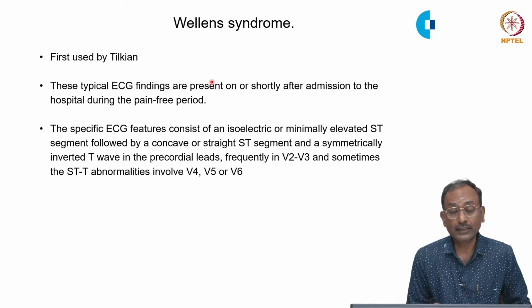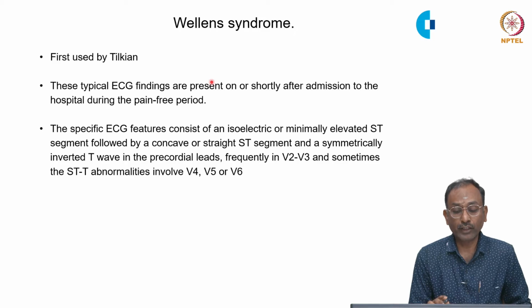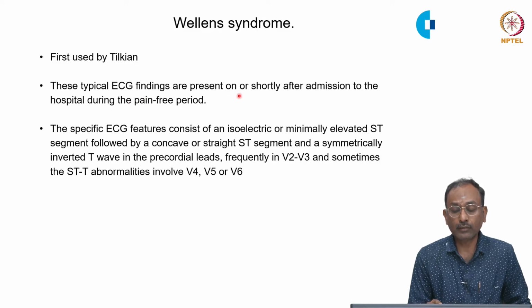Now, I am going to discuss a subtype of unstable angina called Wellens syndrome. Identification of Wellens syndrome is very important. The term Wellens syndrome was first used by Tilkian. The typical ECG findings are present on admission or shortly after admission to the hospital, and the ECG changes are classically present during the pain-free period.